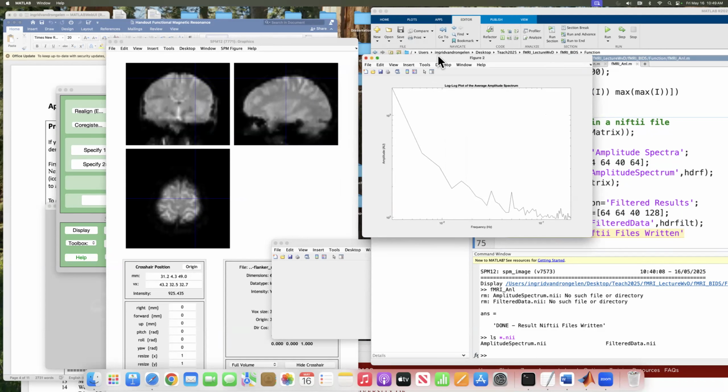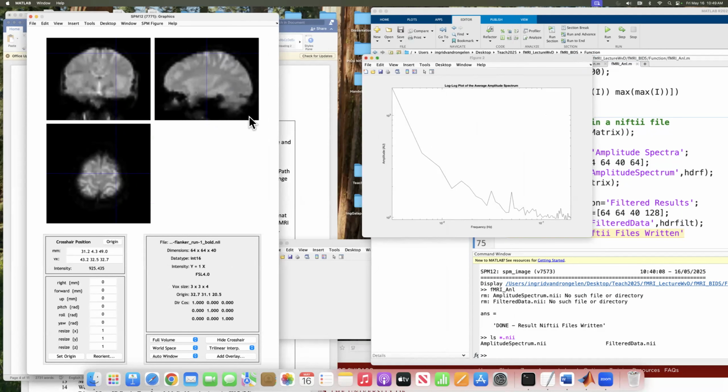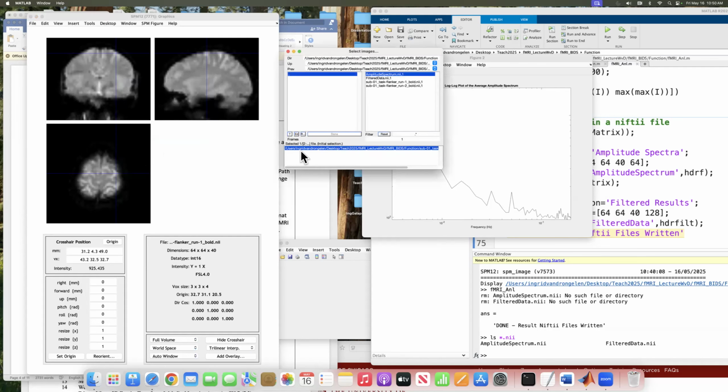I think that's the part that I wanted to show you from the proprietary data set. Now I also want to show you one thing that you can use if you display stuff in the unit. If you are looking into this Nifty file, and you want to look at what the data looks like, more like we are used to looking at it, then you can do a right click, and then you can hit browse, and then you get your own dialogue again.